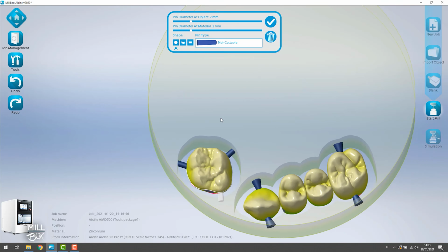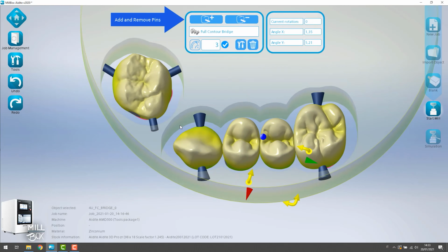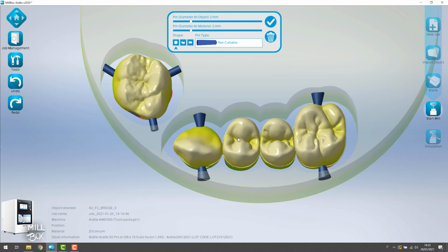Now also we can directly move the pins from the top view. It is very easy. Then we see how to add and remove pins. Just put the right parameters. Select the pin type, cut for example, then click to create the pin. Now you see the different color.